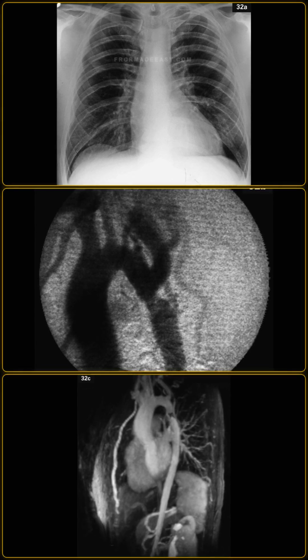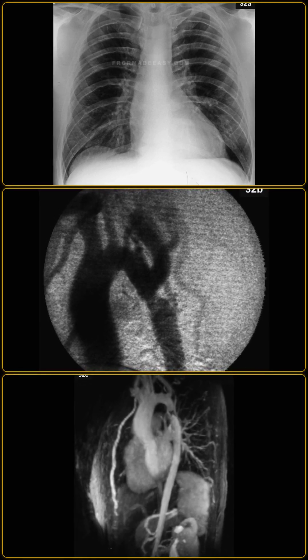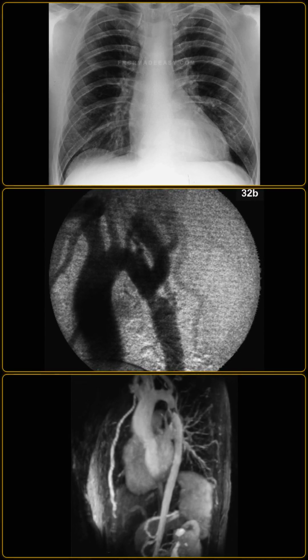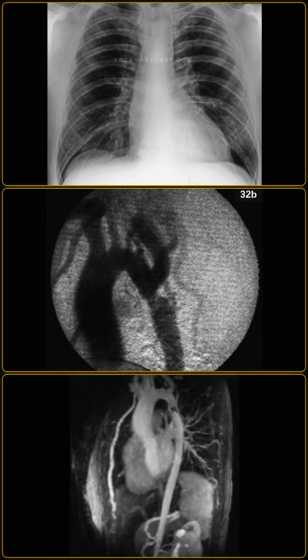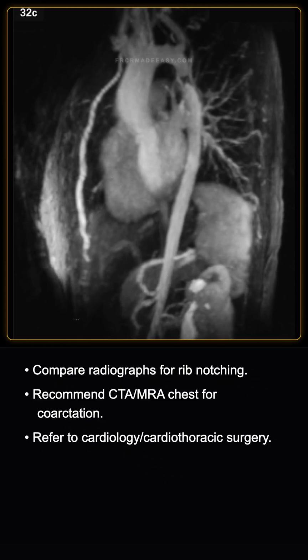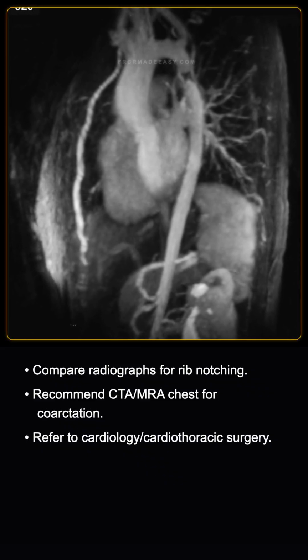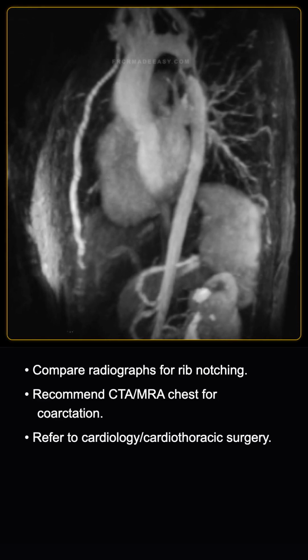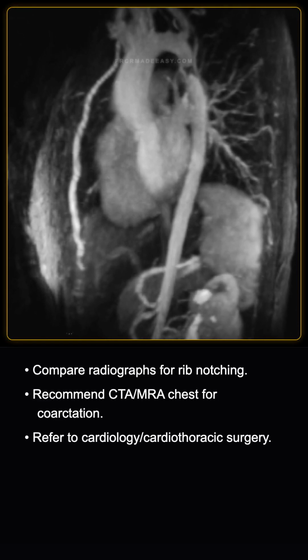How would you manage this patient as a radiologist? I would compare the chest radiograph with prior films to evaluate for any signs of cardiomegaly or progressive rib notching. I would communicate the finding of bilateral inferior rib notching immediately to the referring clinician due to the high association with systemic hypertension and aortic dissection.